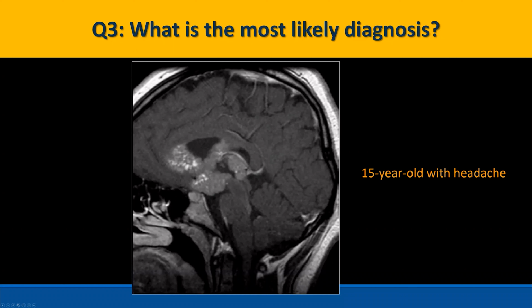Okay. So then it's presumably enhancement. Just off this picture, I would have to say it may be solid, or cystic and solid with some enhancing components. So in a 15-year-old, I'd wonder about craniopharyngioma, or less likely a germinoma, just off this picture.